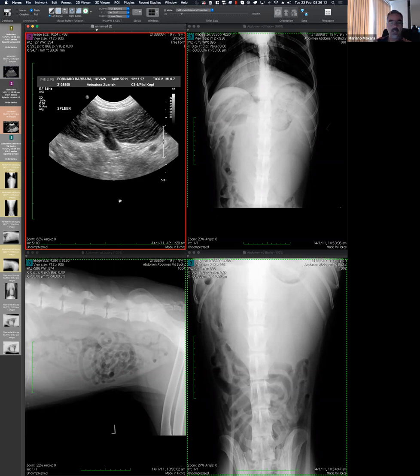It's the same thing with a mesenteric torsion, or a herniation of a bowel loop through the mesentery. The arterial blood supply can still go, but venous return is obstructed. So if you look at that bowel, it's going to look red and thick. There's a lot more fluid and blood that cannot come back.